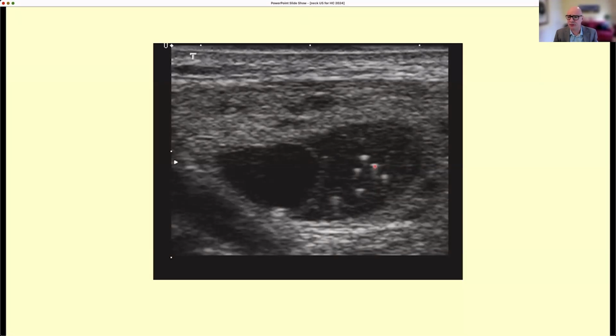It's a colloid nodule. It is very important to distinguish them from microcalcification because these are actually a marker of benignity. And again, there are many radiologists who don't understand this well. And to a certain extent, I can understand them. They just don't want to miss anything. They will call anything a bright reflector. But if you're careful enough, you are able to distinguish a large majority of these.